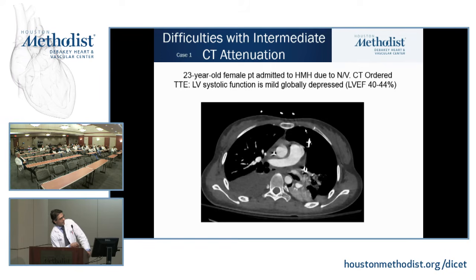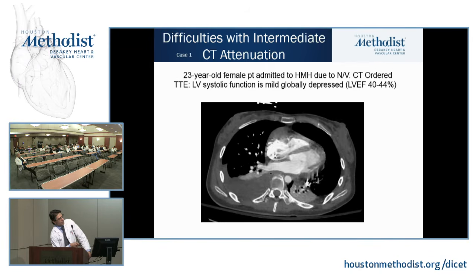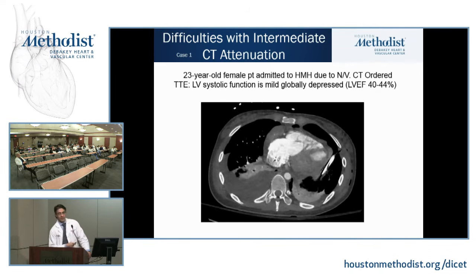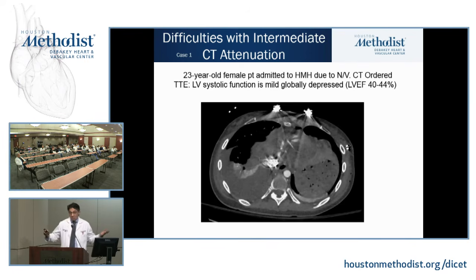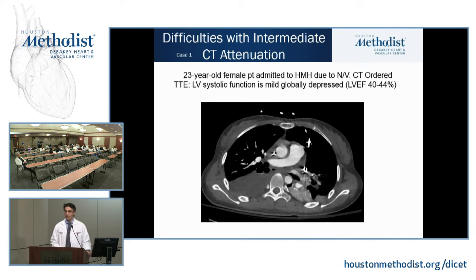Well, there is definitely fluid right here, so I think we'll point that out. And when this movie plays again, I want you to look anterior to the right ventricle. You're a reporting physician, you're reading CTs with us. We're going to have to make a comment on this, right? So this was read out as a pericardial effusion. And I think most people would say, okay, it seems very reasonable. You've got a pleural effusion, may have a pericardial effusion as well.